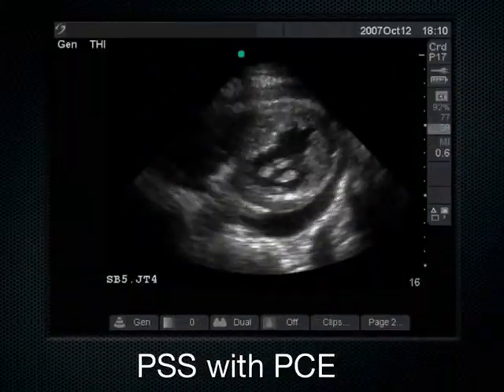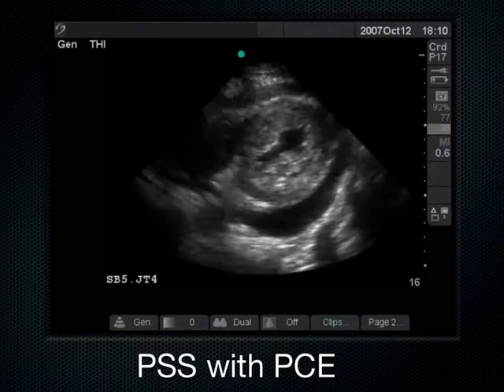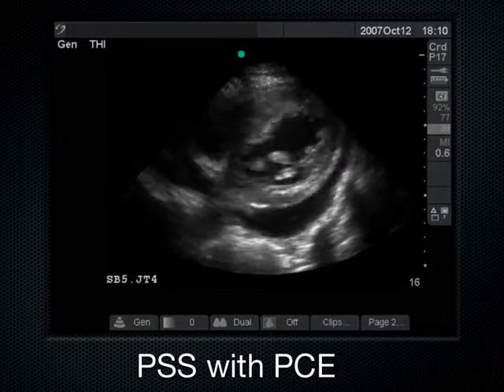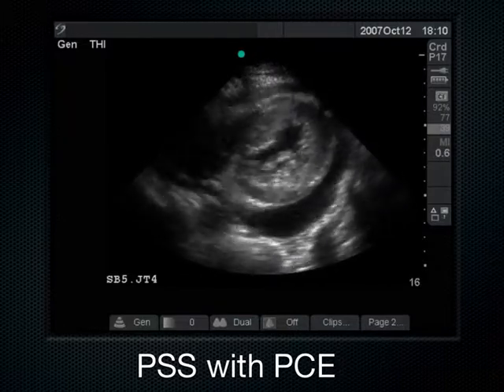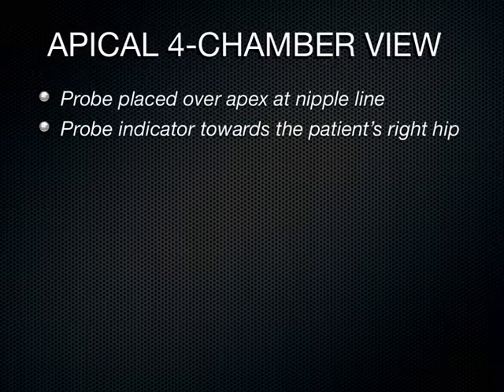This is an example here of what it looks like when you've got a pericardial effusion in the parasternal short axis. Of the four views of the heart, this is probably the one I use the least amount to do my work. However, just pointing it out for the sake of being complete. However, the apical four chamber is quite good for comparing chamber sizes.